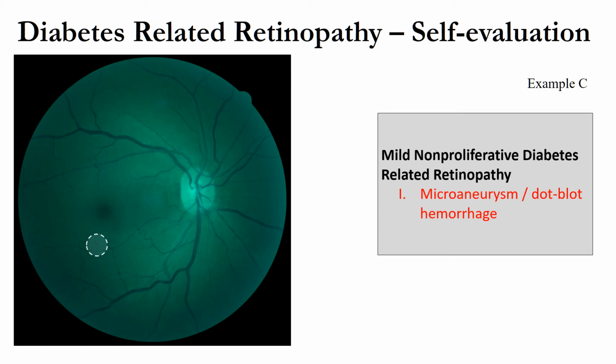The microaneurysm in this image is an indicator of mild, non-proliferative retinopathy.